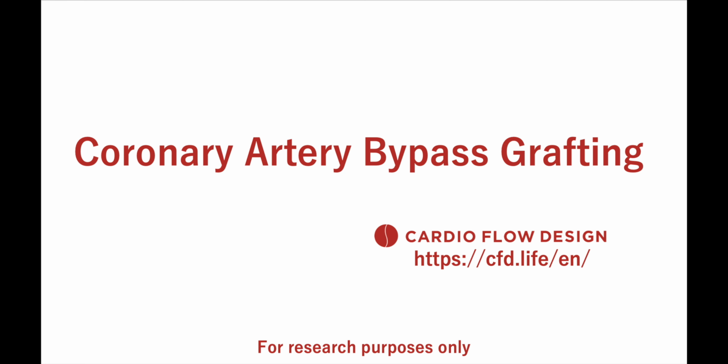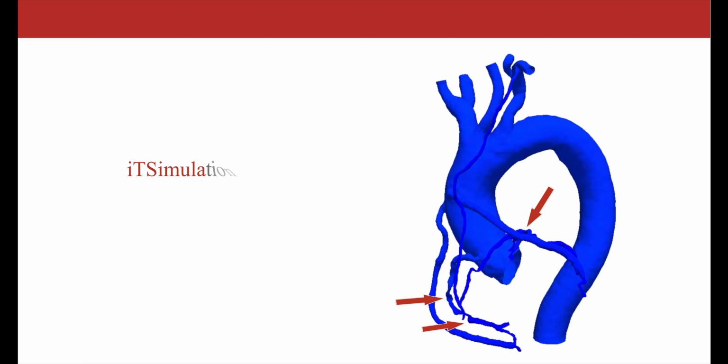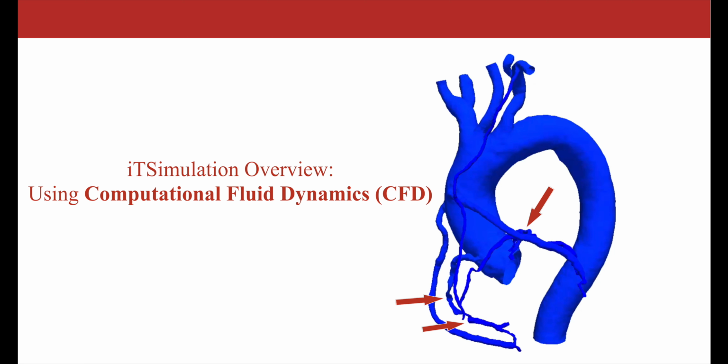Hello. Today I will be presenting cardiovascular flow analysis results simulated using our computational fluid dynamics service, iTSimulation. This patient had a stenosis in the coronary artery, causing a decrease in coronary perfusion volume. We simulated using computational fluid dynamics to look at various potential surgical options.